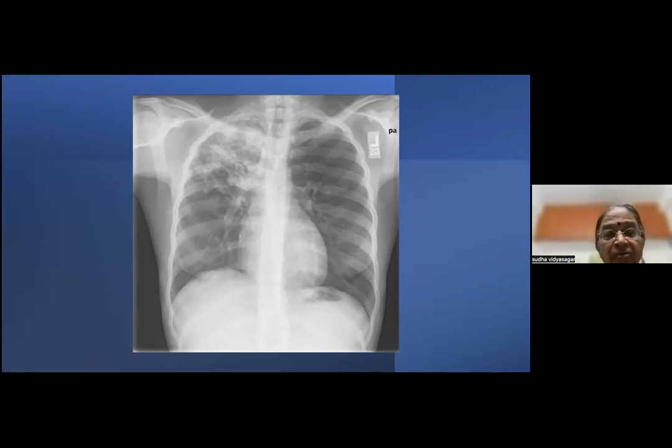They may remain. So fibrosis and cavitation can be there in old tuberculosis or current tuberculosis. Cavity in an untreated patient is a sign of activity. Cavity in a treated patient need not be activity. So remember that if you have soft shadows, what we call as infiltrates, then it's likely to be active tuberculosis. And cavity, if it is untreated patient, likely to be active tuberculosis.